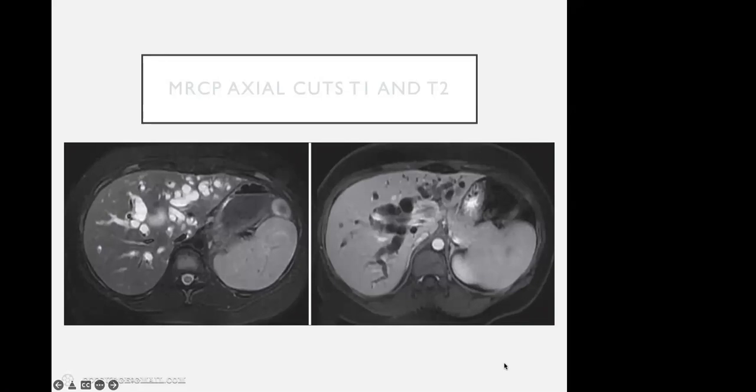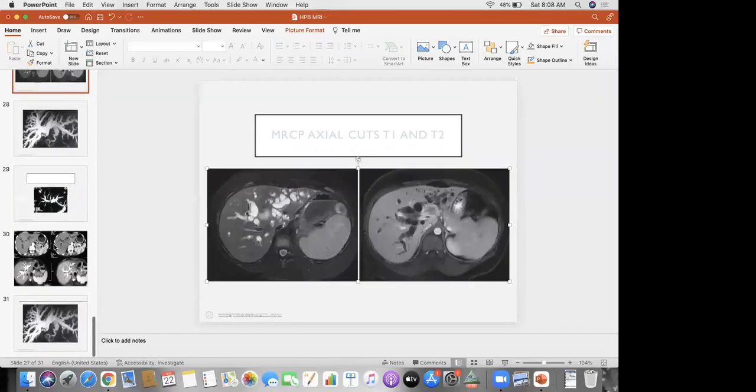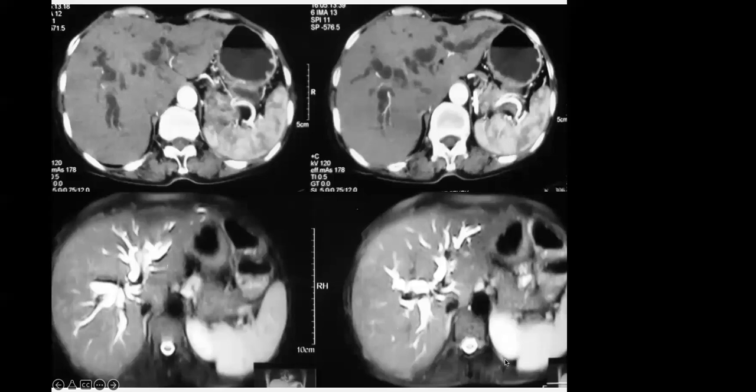Now I'll just show you one image of CT scan as well as MRI. You see and you let me know, what is the difference between a CT image and an MR image? Would someone tell us which of these images are CT scan and which are MRI?